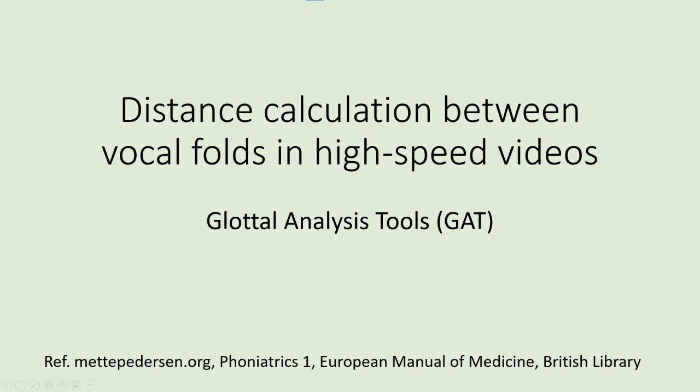Hello, and welcome to this episode on distance calculation between vocal folds in high-speed video using Glottal Analysis Tools.